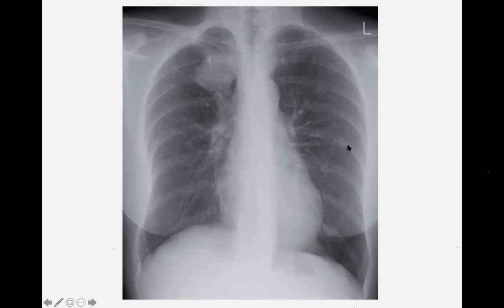And you can also see some white spots in here, here as well. Okay. هذيل الأشياء are metastases that have spread out to the rest of the lungs. أنتم عارفين primary cancer that can develop into secondary cancer by spreading and metastasizing to the rest of the body. So these are the secondary tumors, as you can see, which is not a good prognosis. Okay, so that's a lung cancer, yeah.